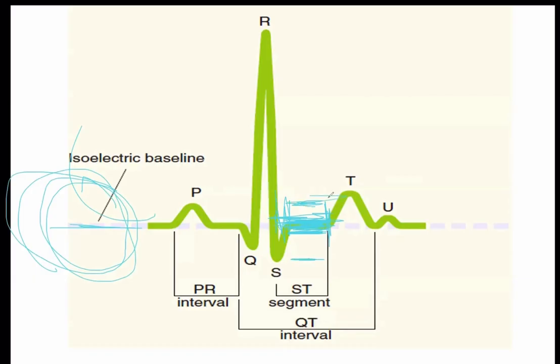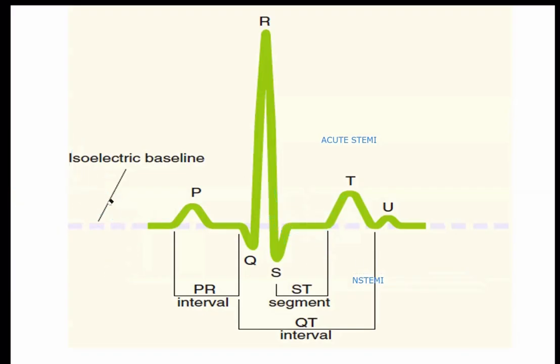If the ST segment is elevated, then I am talking about acute STEMI. And if the ST segment is depressed, then I am talking about a non-STEMI. So this is all about the ST segment. Because the only thing that sometimes can help you to differentiate a real ST segment if you are in doubt is actually the cath lab.